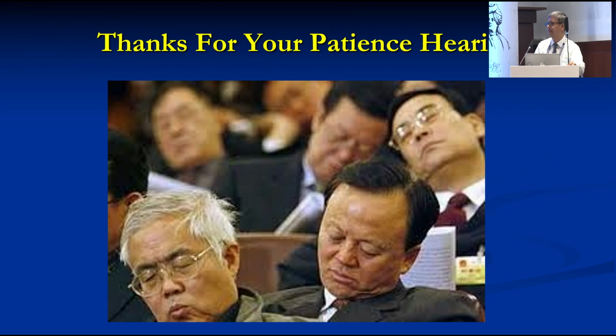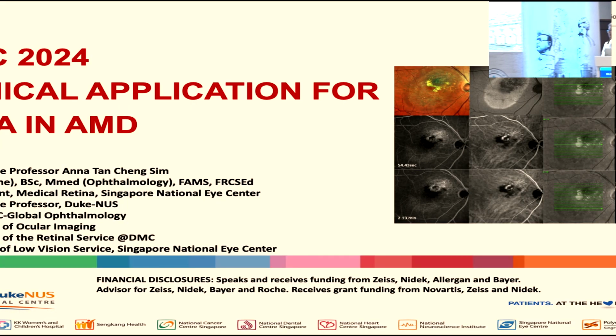Thank you, Dr. Krishnendu. You spoke about ICG in PCV versus RAP, beautifully pointed. The point to highlight here is that both have nodular hyperfluorescence or hypercyanescence, but the timing, early versus late, is one of the important differentiating features, with early in one and late nodular in the RAP lesion, other than the retinochoroidal anastomosis that we see in RAP lesions.